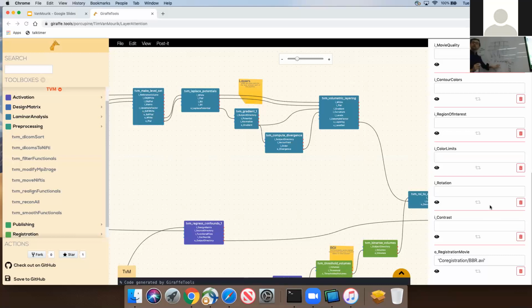Now, if you were to do that for every single voxel, then just like in a temporal design matrix, you could invert this model and say, right, I've got my voxel values, which is my fMRI volume. I regress that against my design matrix, and I've got my value, my signal intensity for layers 1, 2, 3, and just for free, I get the white matter signal and the CSF signal with it, right?